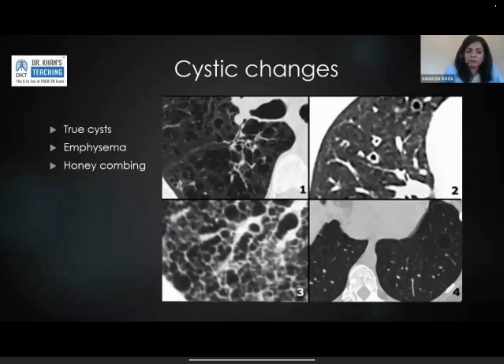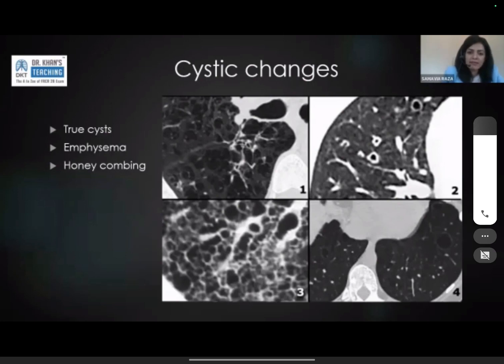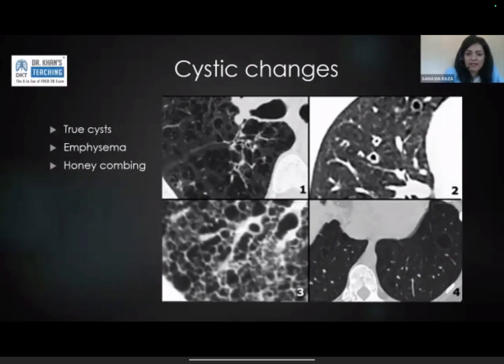When you look at number 1, and the question is, does the patient have cystic lung disease, you have to look a bit more closely, and you have to look for the signs that can help you differentiate between emphysema and cystic lung disease. In cystic lung disease, you are saying that the cysts are within the lung parenchyma. In emphysema, what looks like a cyst or a space is actually destruction of the airspace. So emphysematous spaces do not have walls. What they do have is remnants of structures that used to be normal lung stranding through them.